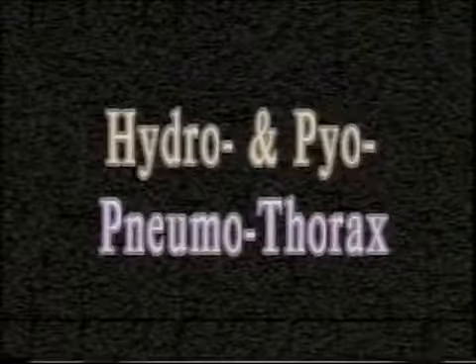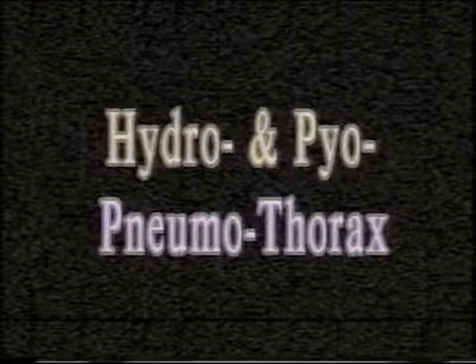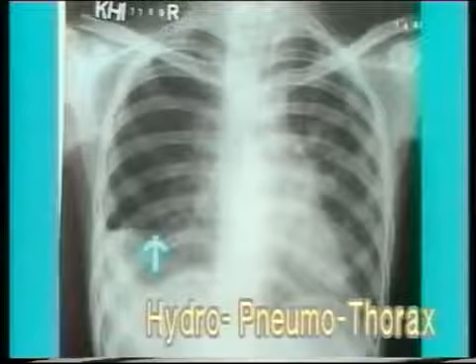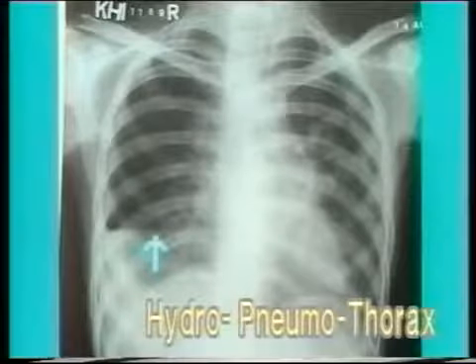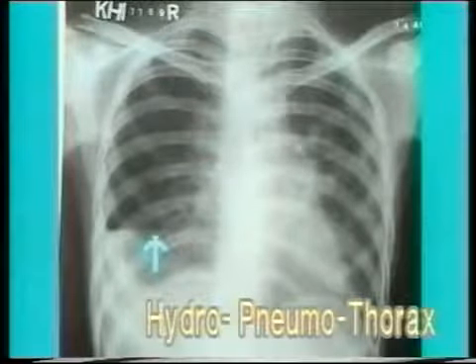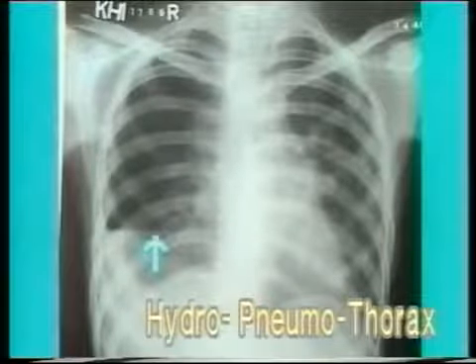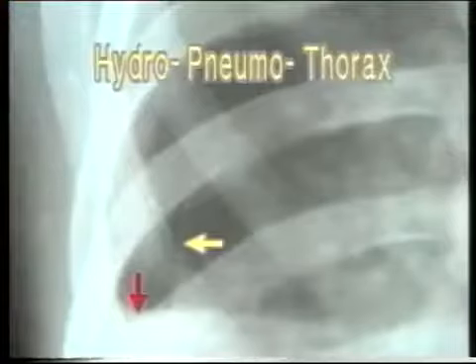Hydro and pyopneumothorax. When the pleural cavity contains both fluid and air, the condition is termed hydropneumothorax if the fluid is clear and pyopneumothorax if the fluid is pus. This X-ray shows a horizontal fluid level in the right hemithorax which is touching the chest wall laterally.